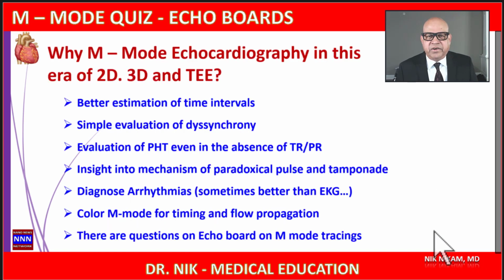In this presentation, we are going to look at some M-mode tracings that may be useful in preparation for echo boards. Why M-mode? M-mode echocardiography in this era of 2D, 3D, TEE, cardiac CT, MRA, nuclear stress test. Why do we need an M-mode? This is an obsolete technology.